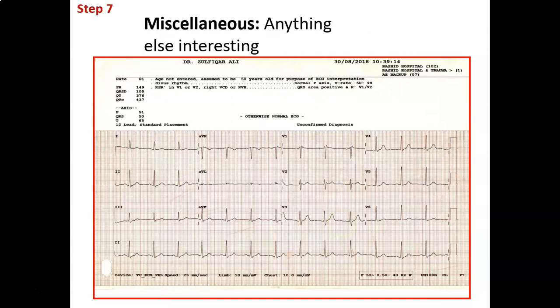Anything else interesting? The QT interval seems to be normal, less than half of the RR interval. No U waves, no J waves. There is no lead misplacement.